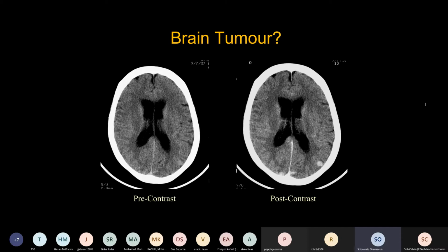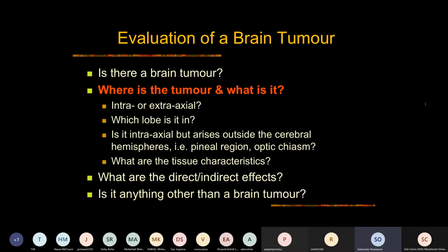If you see a necrotic lesion, you want to know whether it's enhancing, which will tell you whether it's a tumor. And that's what you do exactly the same thing. They do tell you it's an abscess on that CT. So I tend not to do post-contrast CT in all my brain lesions.